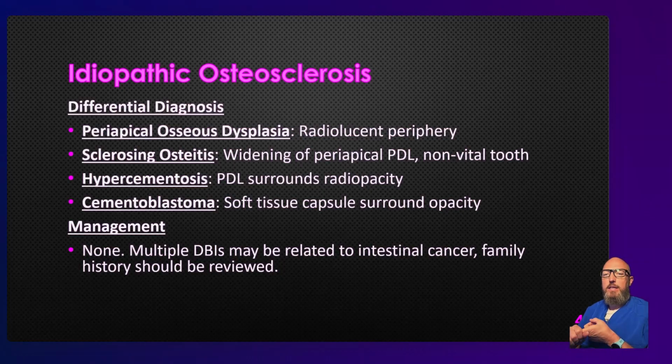These different things, dense bone island, condensing osteitis, and mature osseous dysplasia, those 3 things occur frequently at the apices of the teeth, although idiopathic osteosclerosis not exclusively, and they can look very similar. Together those form an acronym which is part of our CHICO acronym from the differential diagnosis, just those last 3, or ECO. You'll see those come up over and over again. Those will belong on a similar differential, so keep ECO in mind.